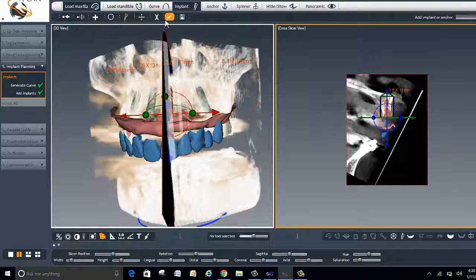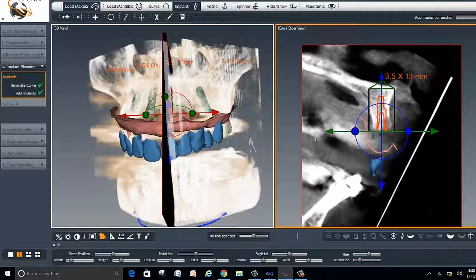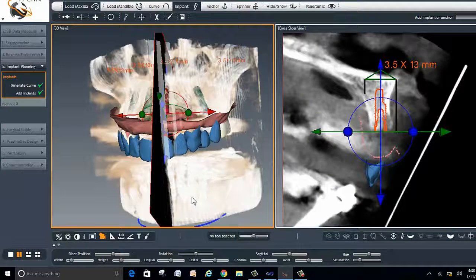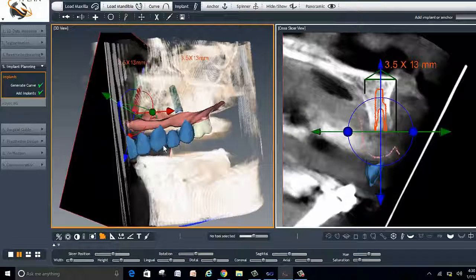Number 9 is going to be the next anterior position for the implants. It'll also be a 3.5 by 13. There's plenty of bone in number 9 width-wise, as you can see, buccal lingual. And if you look at the safety zone, the two black lines around there, it looks like there's sufficient bone here. You don't need to use the osteotome to expand the site.